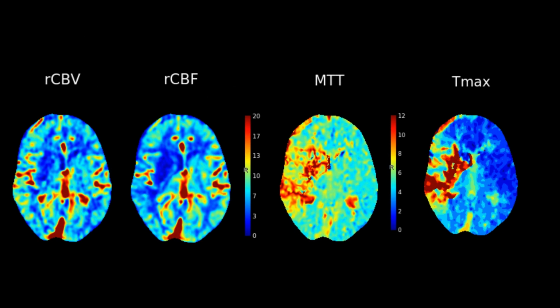This example is from a patient with a right MCA occlusion. The CBF map shows a small area of decreased perfusion in the right basal ganglia, though it otherwise looks symmetrical. However, the Tmax map shows a very large area of elevation in the right MCA vascular territory. This suggests that only a small area is receiving reduced blood, while a large area of the brain is receiving blood more slowly than usual. This patient likely only has a small infarct and a large penumbra, and they would be a very good candidate for thrombectomy.